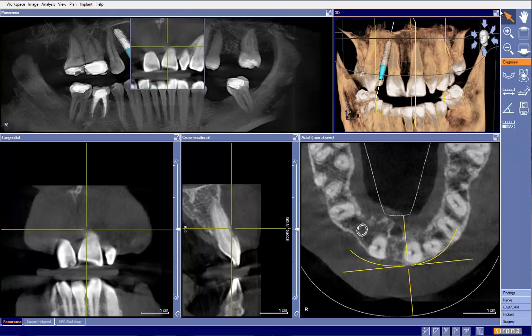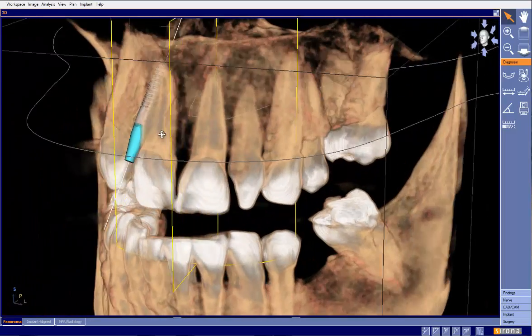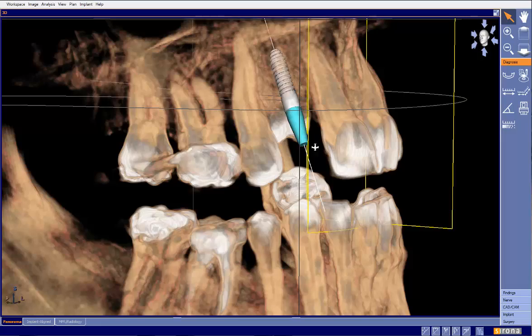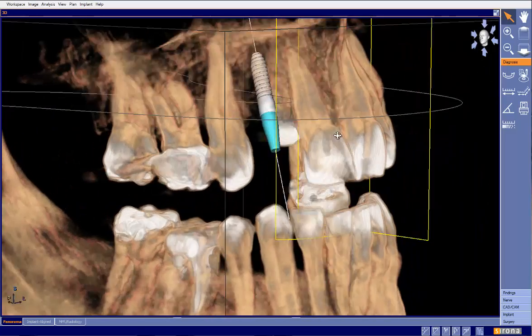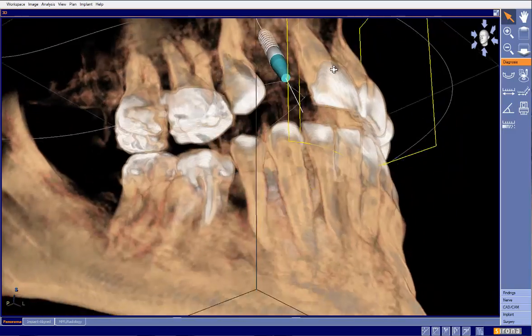My diagnostic assessment in this particular case is that this is probably a great case for some orthodontics, maybe a little bit of stripping between 8 and 9. It'll take a little bit of time with orthodontics, but uprighting the root, bringing those central roots together, closing that V diastema there, especially once you disc these teeth, create the diastema, and then that should give you enough space here to actually have room for number 7 and number 6, kind of like we have on this side.